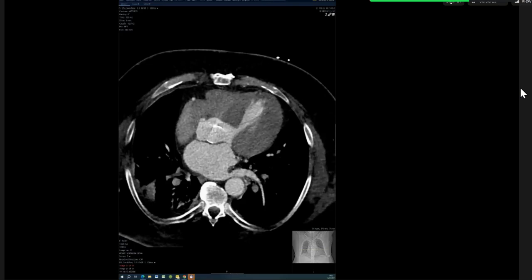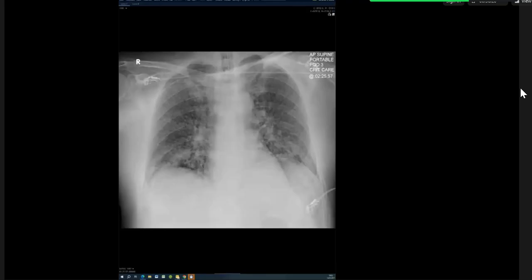This one you should be able to pick. So this one again, try the style of chest X-ray description that we just talked about. Describe it because you can see the abnormality straight away. This is a frontal radiograph of the chest of a mature skeleton. The endotracheal tube is appropriately positioned. I see that there is increased vascular marking seen bilaterally, and there are multiple nodules seen.